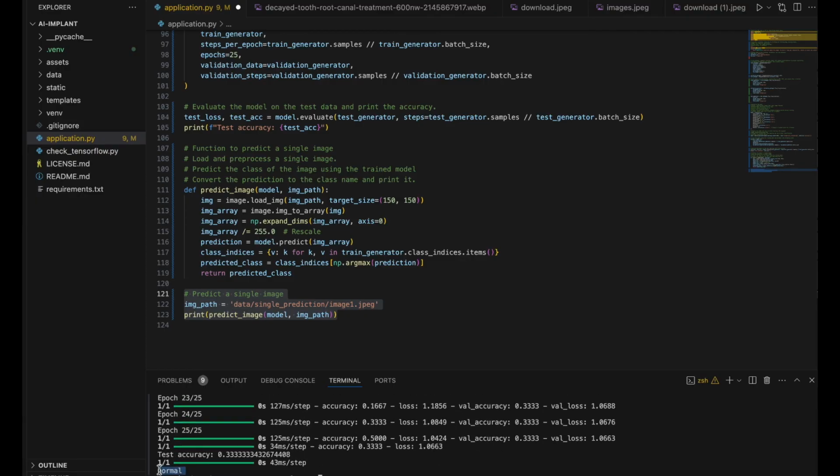See, we have received a successful response. The image we uploaded has been processed and classified as normal.